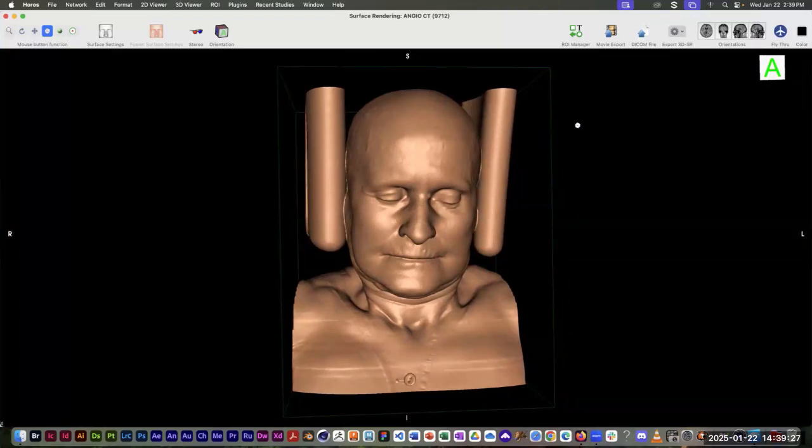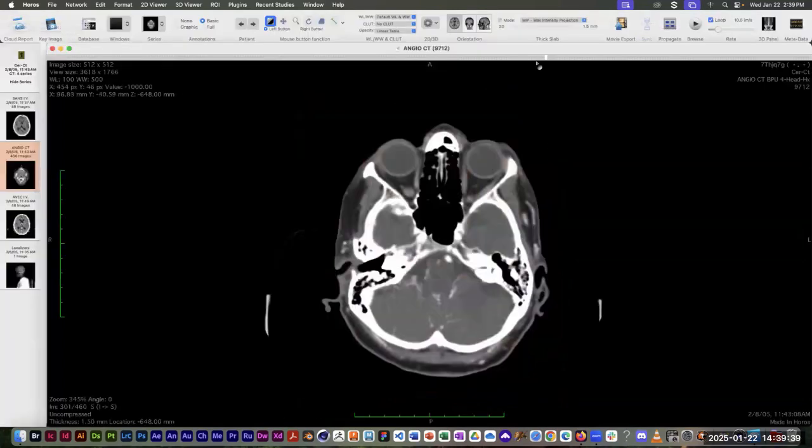Yeah, question. When you get to that menu bar on the top, I noticed it switched a little bit from what it was, like from where we had all of the CT scans to where you hit the button to get to that page. Right here? Yeah.